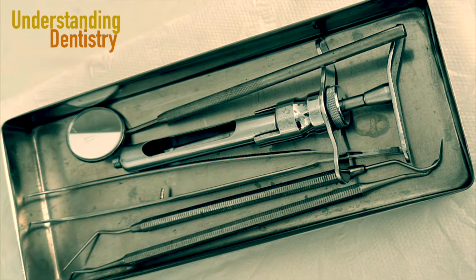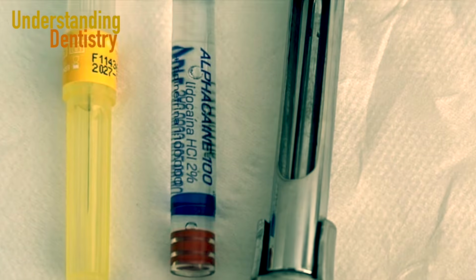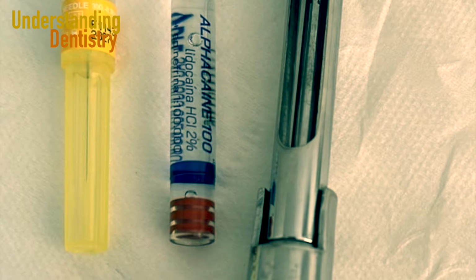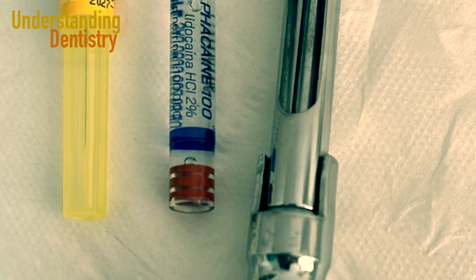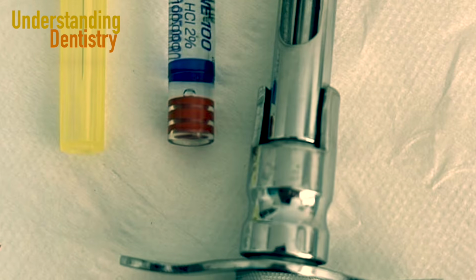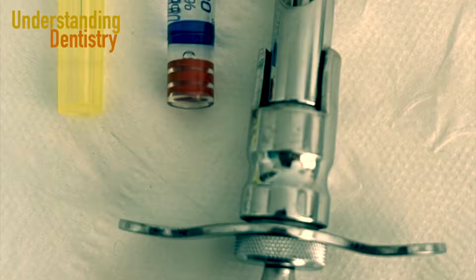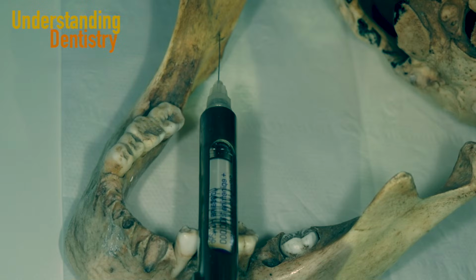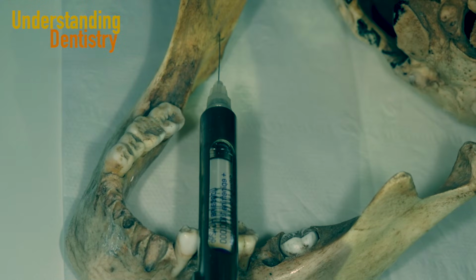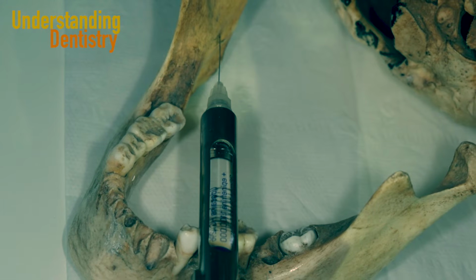All right, this you're going to use for the clinical examinations, and the dental syringe, there are many types, okay? That's the carpule, and this is the anesthetic cartridge, and the needle. All right, so the needle is on the left, of course, and you need to choose the best type for you, and then long needles will be used for blocks like this one, for example, and then short needles will be used for infiltration anesthesia.